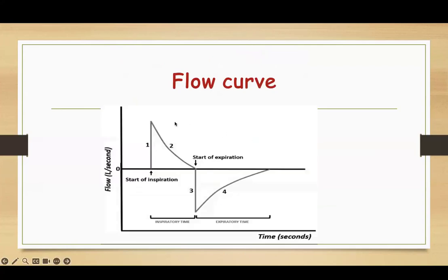Now coming to the other scalar, this is, in fact, if you want to learn graphics, you can just learn two curves and you will know 90% of the diagnosis. So one of the important curves is the flow curve. This scalar is different from pressure time and volume time because it has a positive wave and a negative wave.